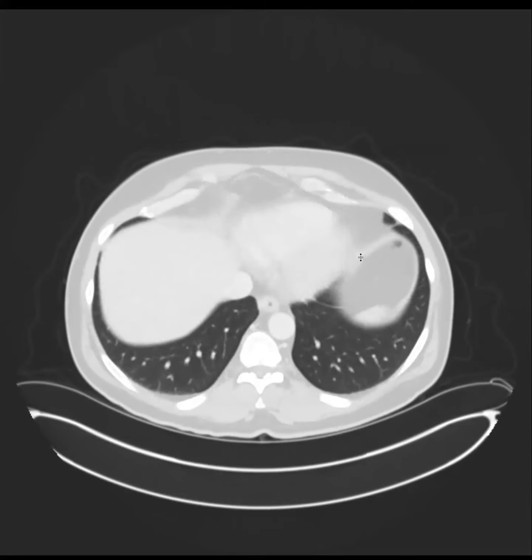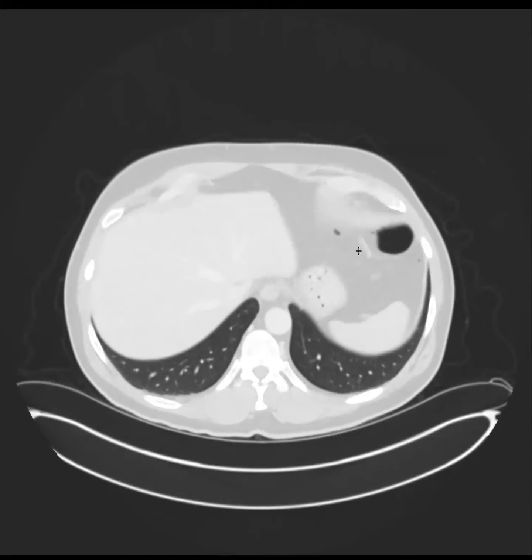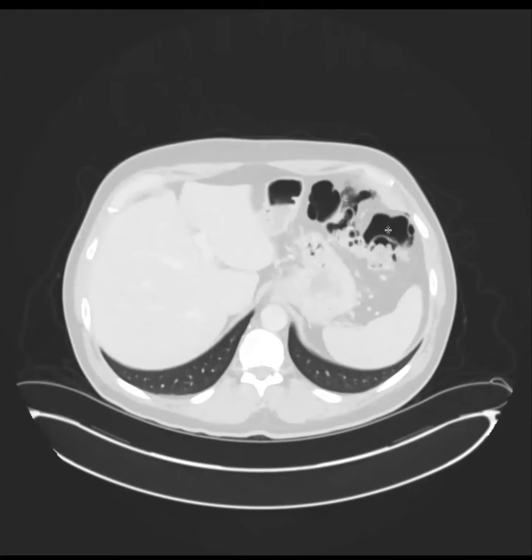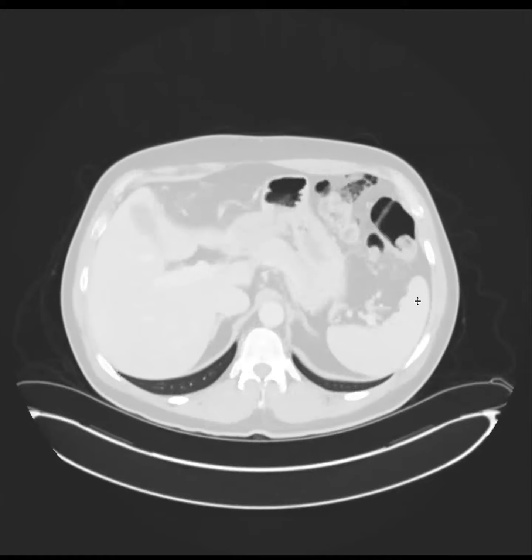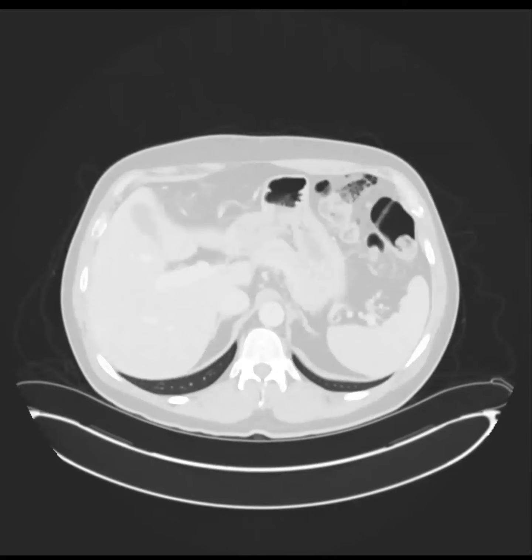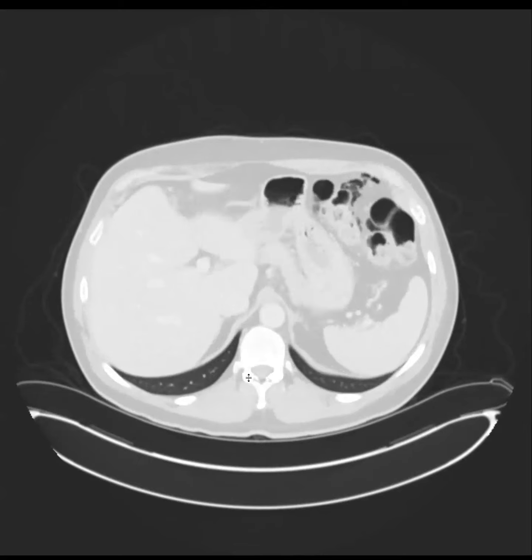And we see free air. There's benign free air here, little air bubbles there, big blebs here of air under the transverse colon. It still looks like a benign thing, like you said, 2 years.